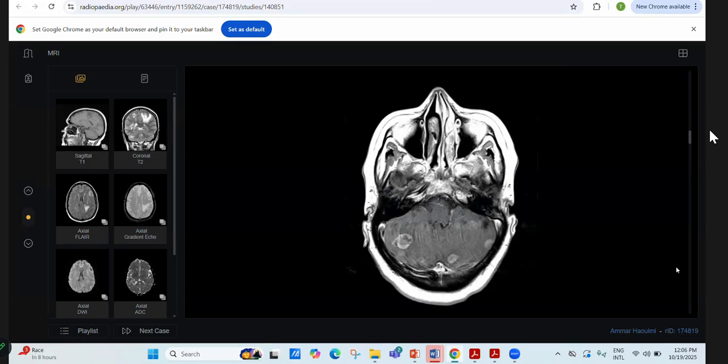I would like to know the history of the patient. If the history is suggestive of infection, I would categorize these as multiple tuberculomas, since these are predominantly T2 hypointense and representing the morphology of granulomas. However, if there is any known primary, these can represent multiple intraaxial supratentorial and infratentorial metastatic deposits. I would also like to screen the whole neural axis.